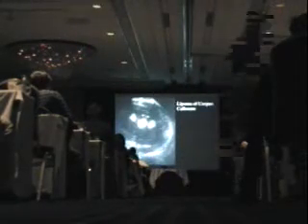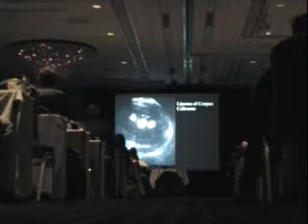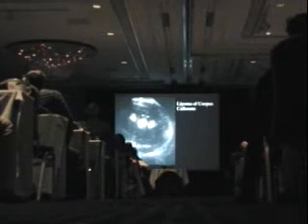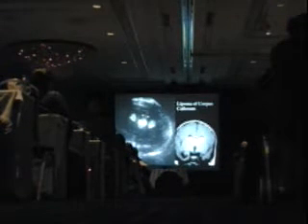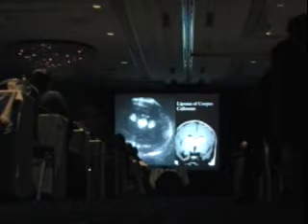This is another case of lipoma of the corpus callosum. They are absolutely pathognomonic. There is nothing else that's going to sit in the center of the brain. Very symmetrical, very bright. Sometimes they have these little extensions, little antennae here. But in any case, this is a lipoma, and there's essentially nothing else that will do that.